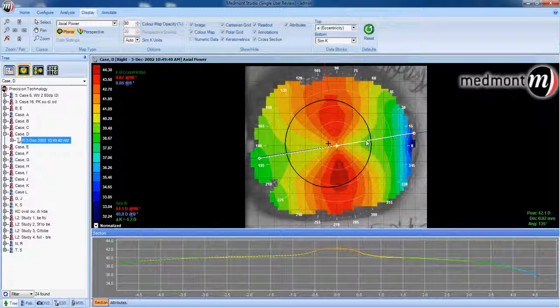below the colorized map. That way you can determine, is there a point where the rings collapse, come together, or distort, which could create a false area of information. We can change the appearance of the topography by clicking or unchecking some of these different options, and you can choose which is best for your specific office. The selected options here would be recommended as a default.